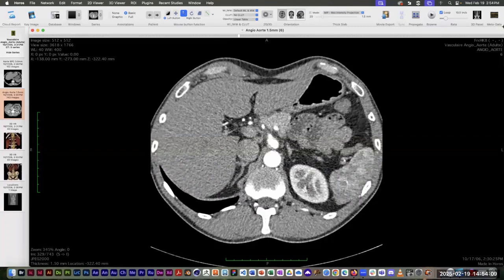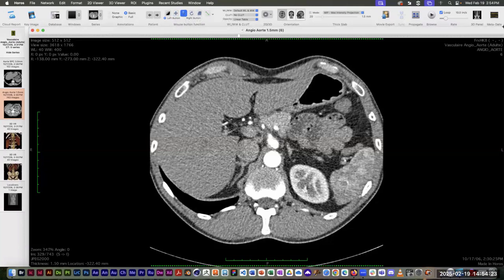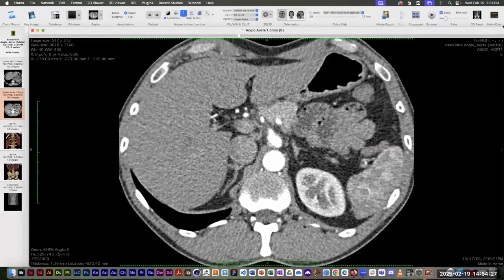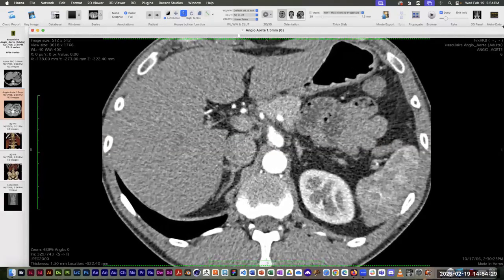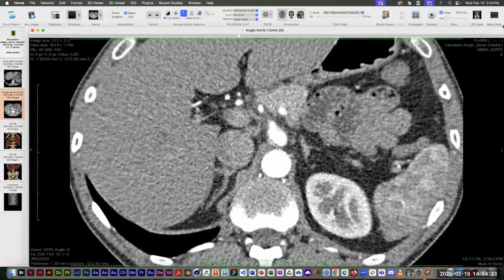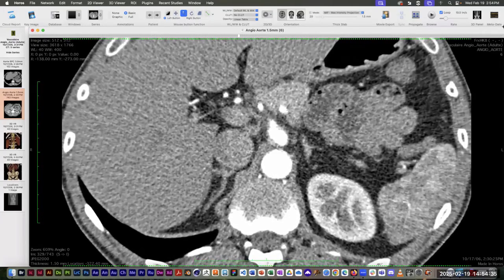All right, so I've seen roughly where it is, and again my magnifying glass won't work, so none of these tools are behaving. All right, well, I can use the up arrow to zoom in. It's odd, though. I don't know why the magnifying glass isn't working.